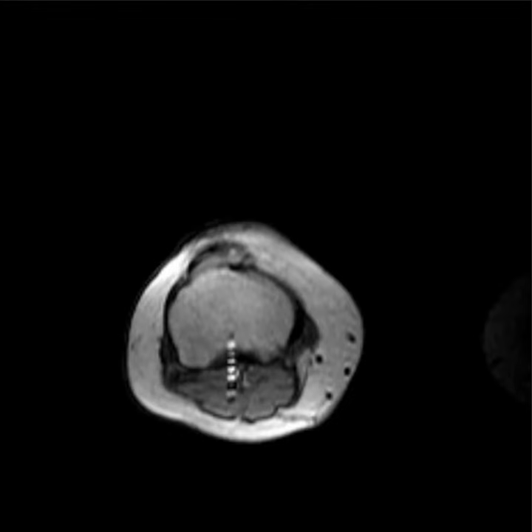Yeah, sure. We have a lot of different kinds of cases. For example, we have this 28-year-old female patient who had a trauma to the knee, and X-ray was not very helpful, so MRI was requested for her. Would you like to start?